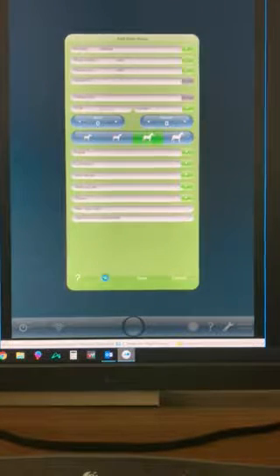the Start button. In this case, my sensor is not plugged in, so we're not able to take an image, but we can see the new anatomies that are on the side here. Previously, there was only up to the teeth on the anatomy list. You'll notice it also defaults immediately to the head anatomy picker.